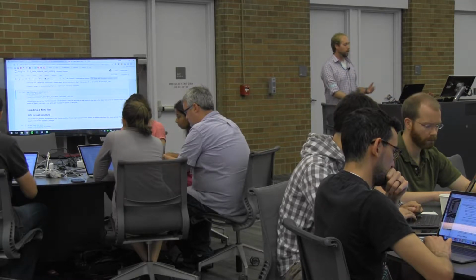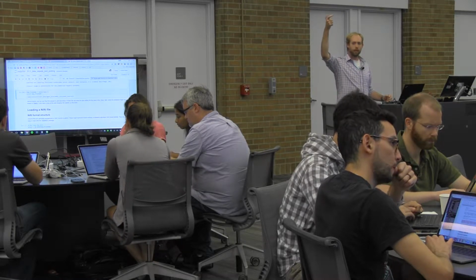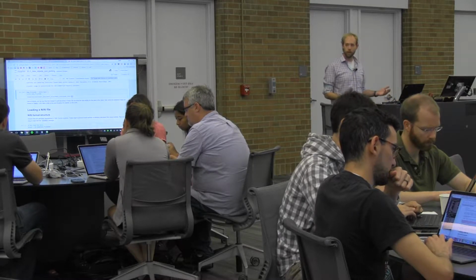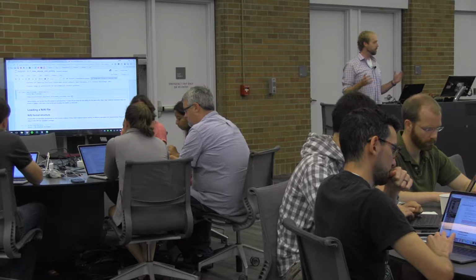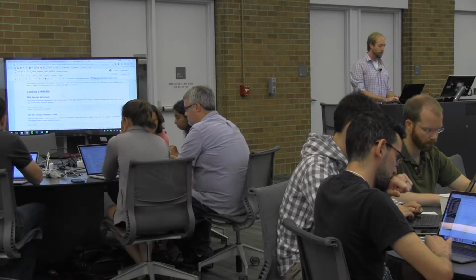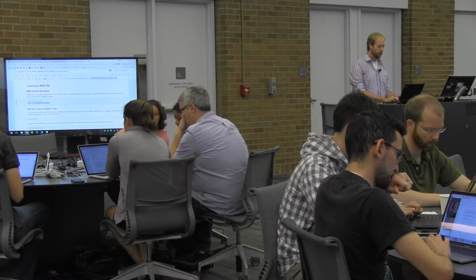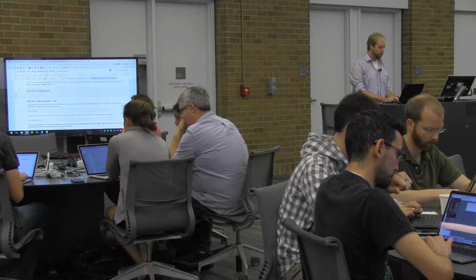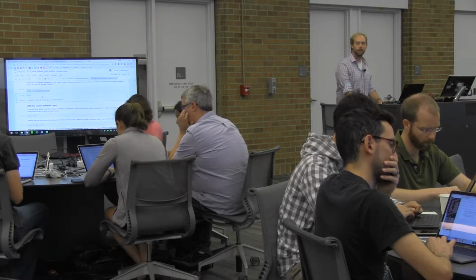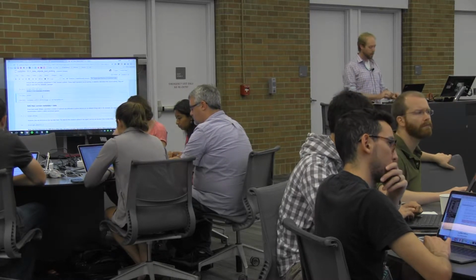And as we'll see, effectively what nilearn did was it went up into the internet, it found the URL for that data set, and it pulled it down as this .nii file right here. It's also called a Nifty file. I'm not going to go into too much detail there because I think most people know what Nifty files are here. But we can use NiBabel to very easily load this Nifty file into memory. And to do that, you just use nb.load like this right here. So when we do that, it returns to us what is called a Nifty image object. And this is effectively a wrapper around the raw data itself that gives us some extra metadata and information about it as well.